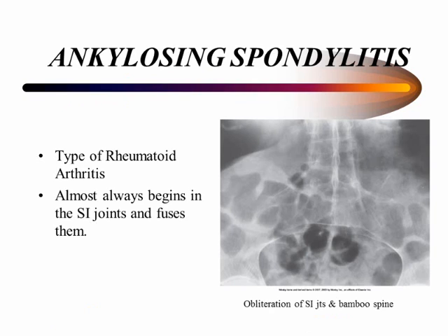Ankylosing spondylitis, which is a type of rheumatoid arthritis, almost always begins in the sacroiliac joints, causing bilateral and usually symmetric involvement. Blurring of the articular margins and patchy sclerosis generally progress to narrowing of the joint space and may lead to complete fibrosis and bony ankylosis. The disease typically progresses from the lumbar spine upward.